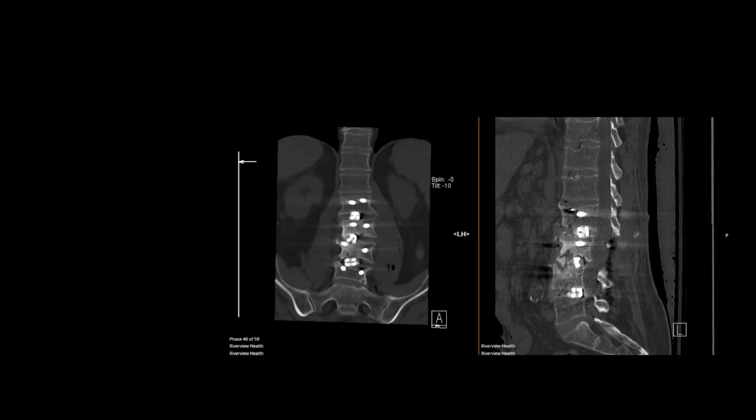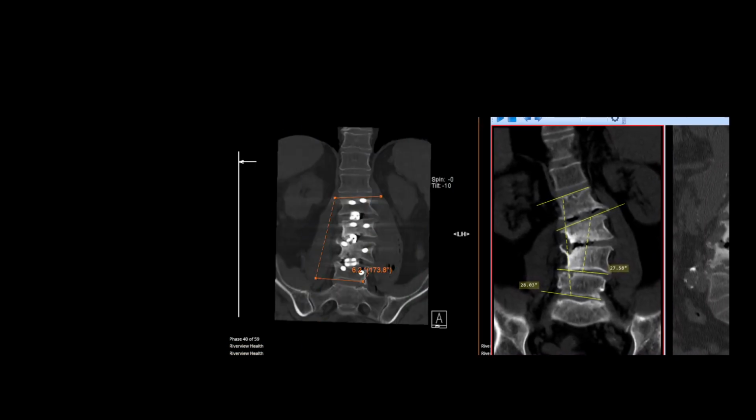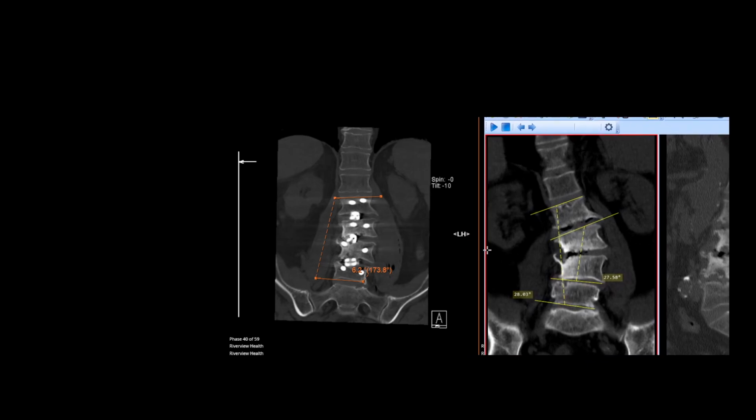The curve angle I'm going to measure here, I'm expecting to be significantly less, even not completely corrected. It's about 6 degrees, which is significantly better than what it used to be in previous films here. Now, what's important on the right side, when patient stands up, this goes to about 40-45 degrees, whereas on the left, because of the instrumentation, when patient stands up, this remains.